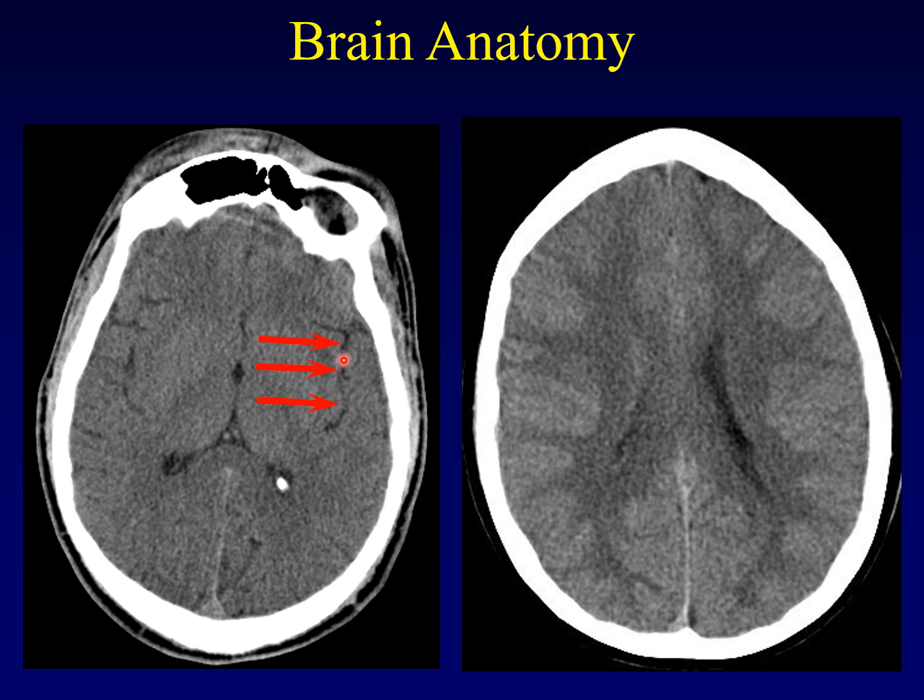This arrow is along this curved line right here, sort of a J shape, I suppose. What's that object? Well, that is the Sylvian fissure, right? It is filled with CSF, just like the ventricles, same color as the ventricles, so full of water. CSF and water are essentially the same thing. CSF is essentially water.